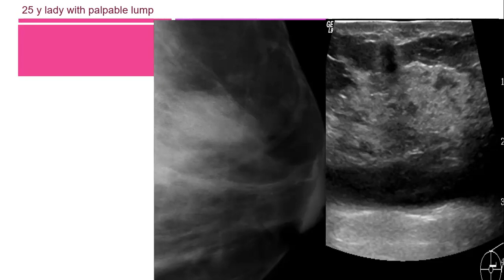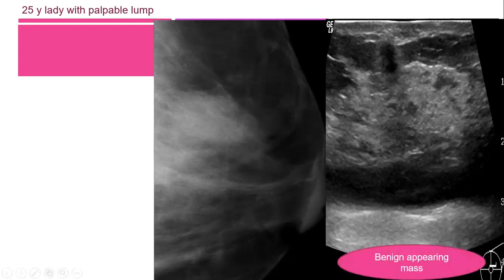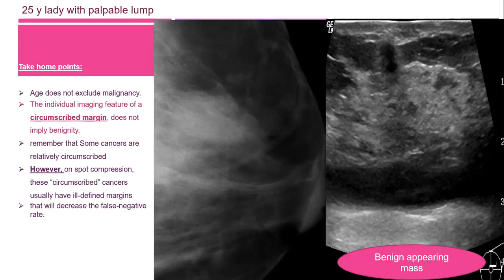And fortunately, if you look here, it's projecting from the fat glandular interface into the anterior parenchyma. And she was lucky to be picked up as small as possible, because it was placed anteriorly. On mammography, it has a benign appearance at first glance at least. That is why it is easy to be missed, and benign appearance does not exclude malignancy.